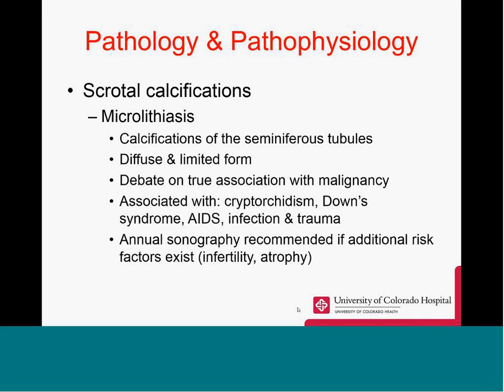There is a debate on the true association with malignancy. In years past, gentlemen that had testicular microlithiasis were followed every 6 months or so. With more research happening, they don't feel the association is as high as once thought.